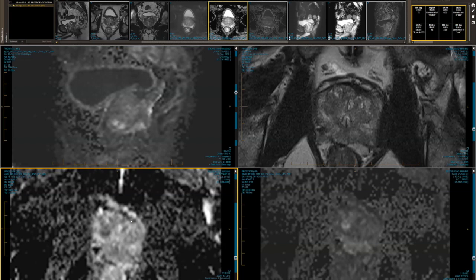So we've sort of kept to Likert scoring, a 5-point scale based on our probability of where we think our suspicion for tumours is. And yes, we involve all of those lexicon things that you get in PIRADS version 2, but it allows us to use it for all of the different prostates that we see.